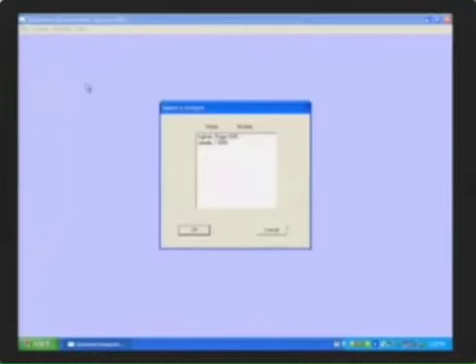Now you have added a file that will store the data for this sample. Next, click on Select Subject. Look for Sample 1 SMS, the sample label you just added, and highlight it by just clicking on it. Then click OK. Now you have opened the file in which you want to store the data. Next, click on the Run SMS label in the top row and select Half-Screen Web Mode.